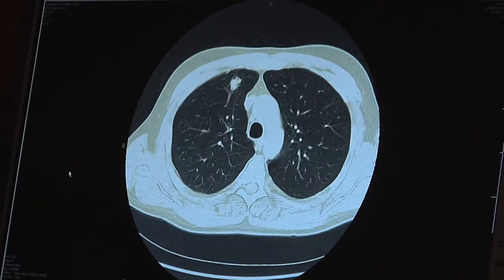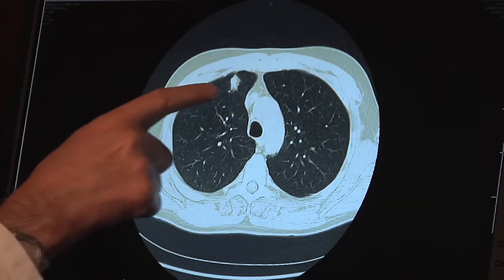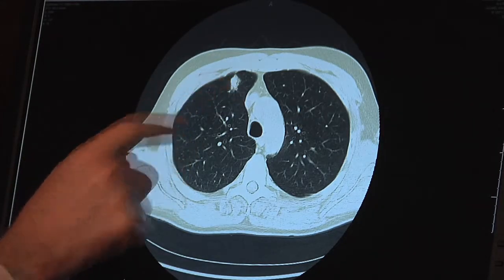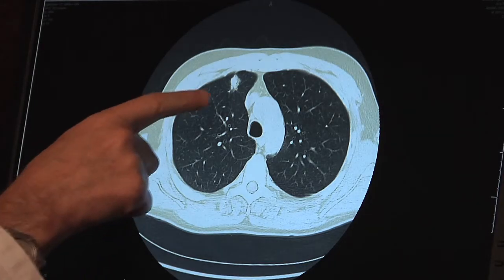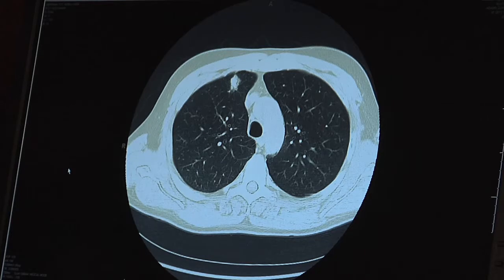And now we're up very close to the top, and now you can see this small tumor. It looks like it doesn't belong, and it doesn't. That tumor is only about an inch big, but you can tell that it's very easily seen with the CAT scan. The resolution of the CAT scan is so good, we can see millimeter differences in the size of that tumor. So we know that tumor doesn't belong there, and that turned out to be a cancer.